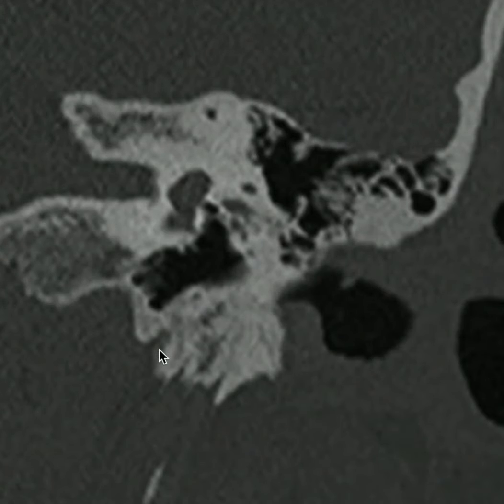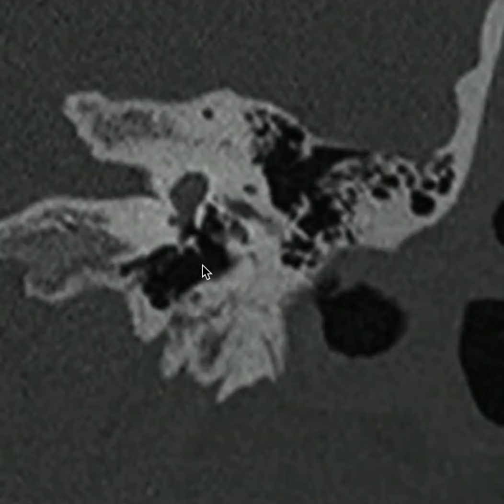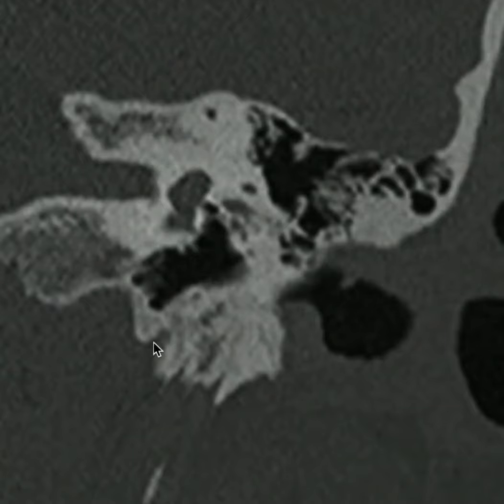This is the inferior tympanic canaliculus. The inferior tympanic canaliculus creates a communication between the jugular bulb here and the middle ear cavity right here. You can see it connecting up at this point. Going back anteriorly, let's talk about the structures that course through the inferior tympanic canaliculus.